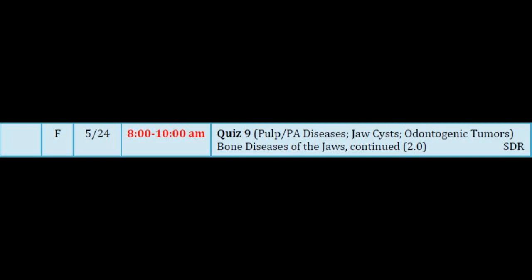This is a patient who has polyostotic disease. Polyostotic disease is often much more on one side than the other, tends to be strongly unilateral, not exclusively unilateral, but strongly unilateral. It's displacing the orbit, it's causing mandibular disfigurement. This is another patient who's got cranial bone involvement and with expansion, and here's multilocular lucencies involving the entire humerus as well as both bones, ulna and radius in the arm. So, other bones are going to be affected as well.